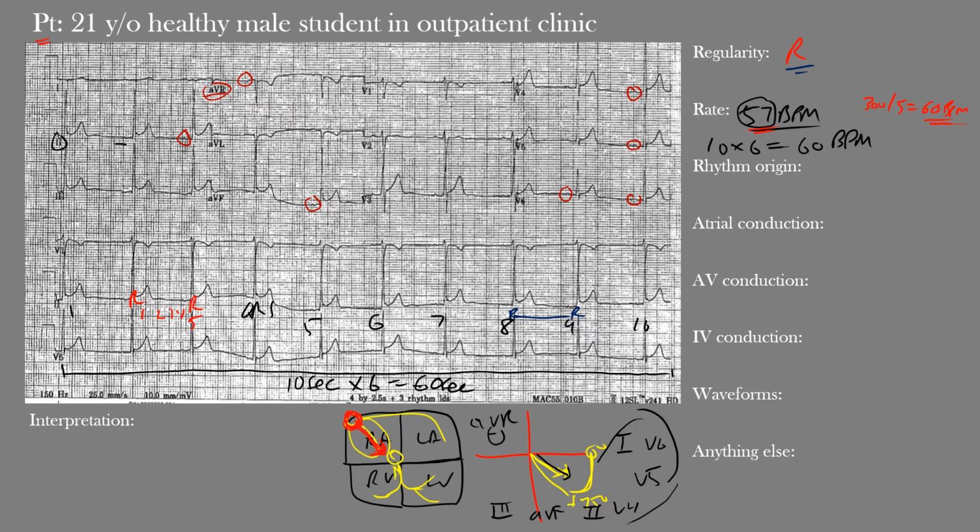Now, another thing in sinus rhythm is that these P waves have to have similar morphology, meaning they're not originating from some ectopic focus outside of the normal sinus node. By doing so, we can tell by the normal P wave morphology, as well as the upright P waves in those leads and the inverted one in AVR. Another thing of sinus rhythm is you want to see a P wave before each QRS, meaning there's a 1-to-1 ratio. For each P wave, you see a QRS.